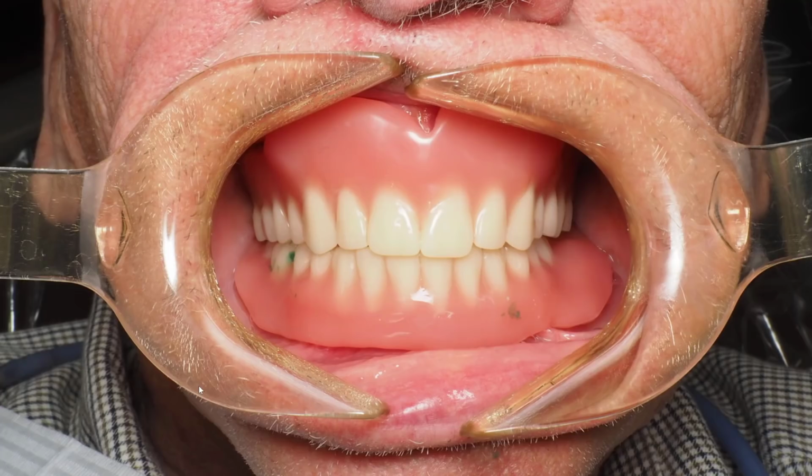And this was the final result for that patient. The lighting's not the best in this picture, but compared to where he started from, this is a big, big improvement. So we went from this, and this was the second time that I saw this patient. I keep saying me, I worked with my associate on this case, but I did the lab work for this. But this is the second time that we saw this patient after getting those master impressions.